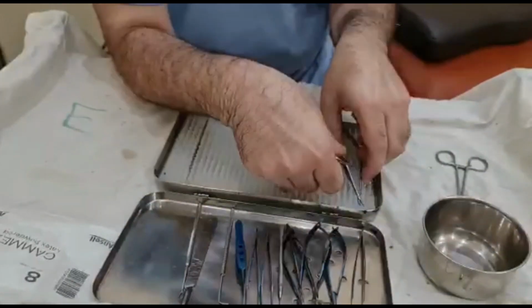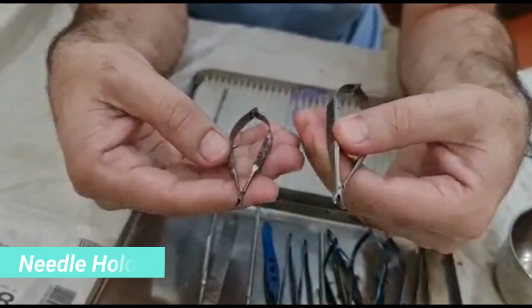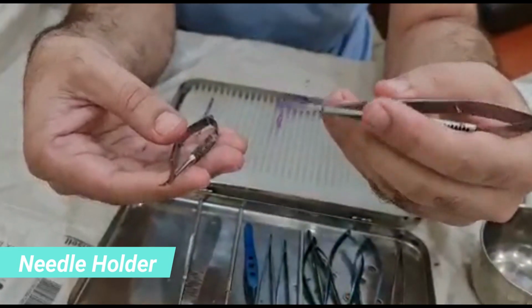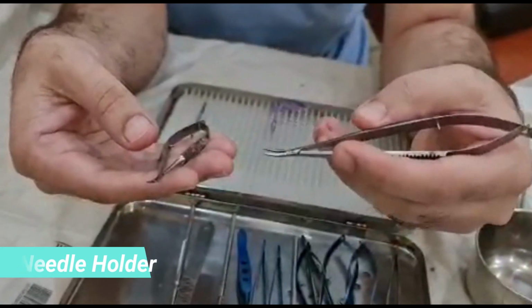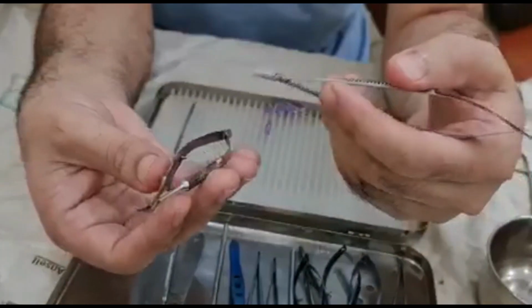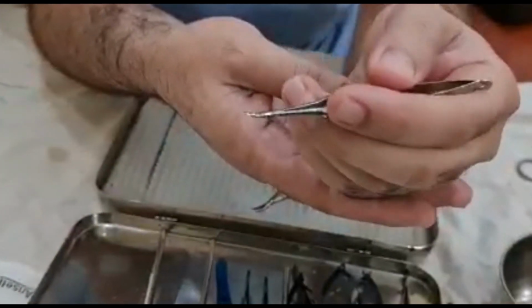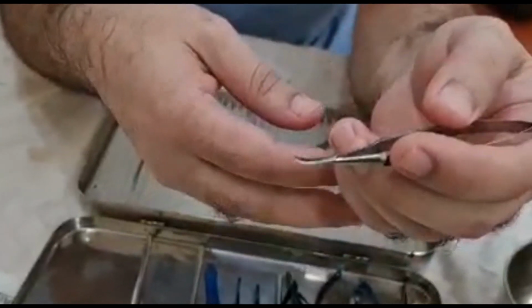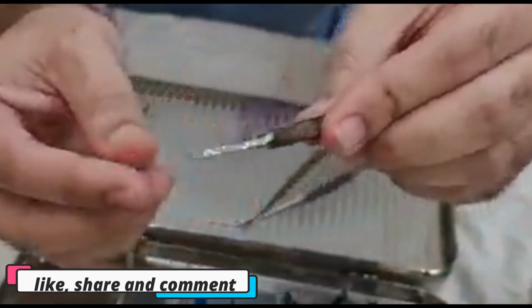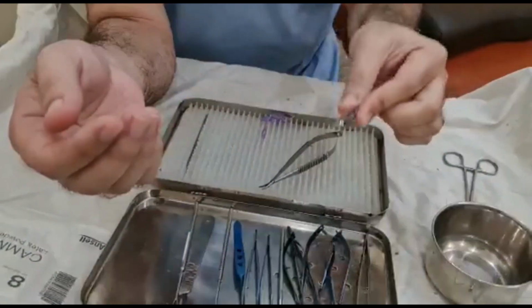The needle holders, we have two of them, a larger one and a smaller one. The larger one we use in skin, eyelid margin, eyelid, and dacryocystorhinostomy. The smaller, more delicate one we use in cataract surgery, trabeculectomy, and keratoplasty. These are the needle holders, with which we hold the needle, and this instrument is used for different surgeries as I explained.